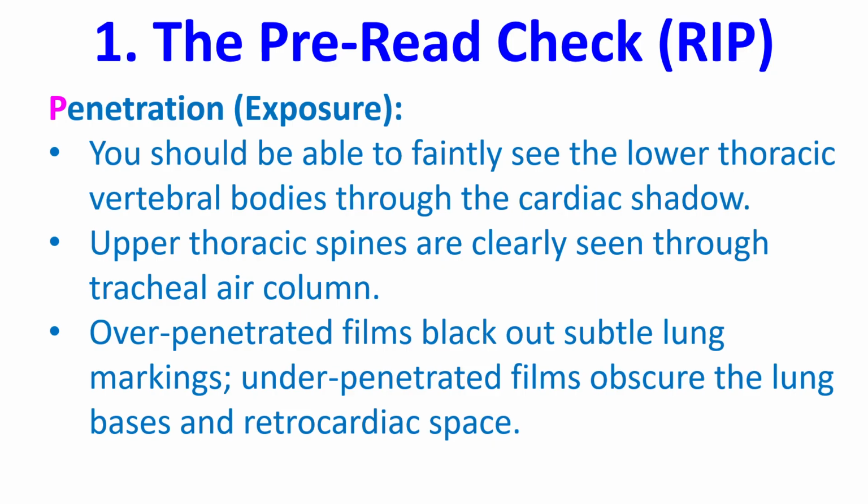P for penetration, that is exposure. You should be able to faintly see the lower thoracic vertebral bodies through the cardiac shadow. Upper thoracic spines are clearly seen through the tracheal air column. Over-penetrated films black out subtle lung markings. Under-penetrated films obscure the lung bases and retrocardiac space.